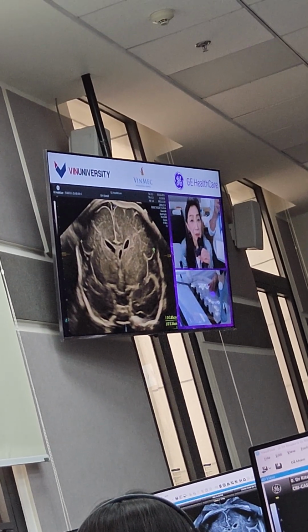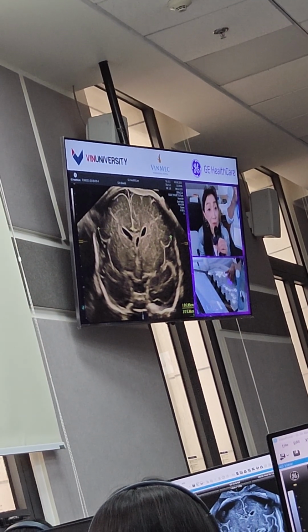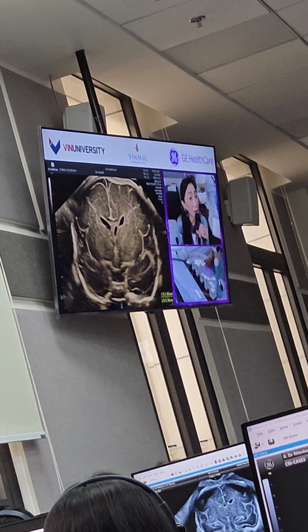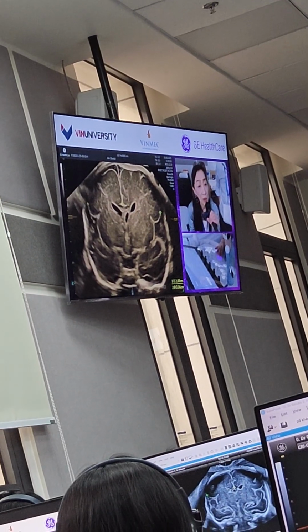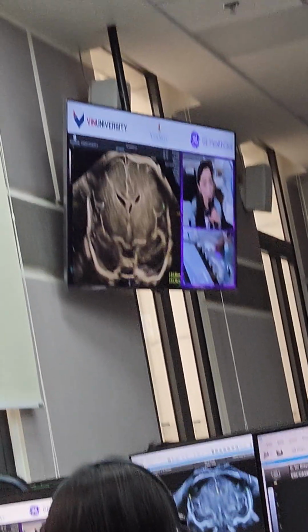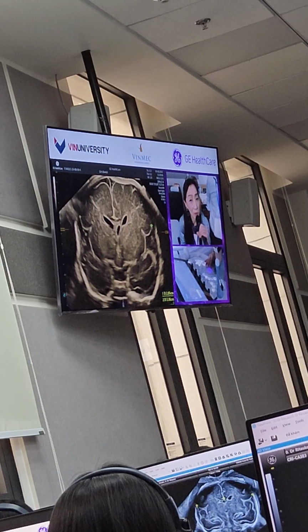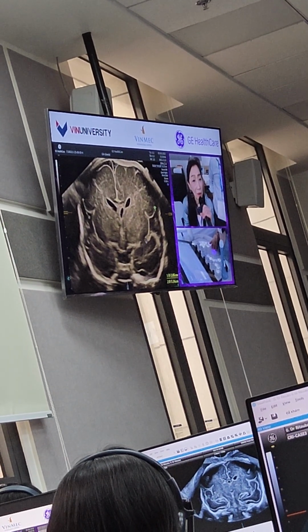Okay, and also this gyrification, there's no gyrification there, right? And the calcarine line, for both sides, it's okay. And Sylvian fissure, this is okay, this is almost 26 plus 6, you know, it's okay. And this one is too much. This is like 28 weeks, 29 weeks of gestation. And this brain is overgrowth.